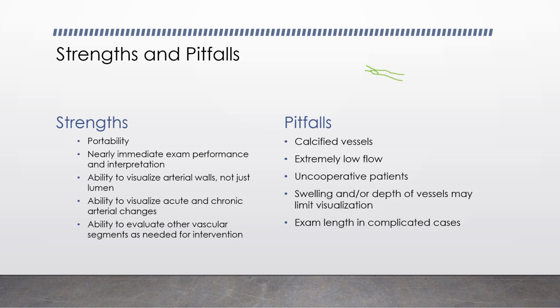Pitfalls. If you've done these exams, you know they can be challenging. So we can have calcified vessels, which can cause a lot of shadowing through the vessel and make it very difficult to assess the vessel either in B mode with color and even in spectral. Other pitfalls are that some of the smaller arteries, towards the distal leg, are going to have extremely low flow. So it can be challenging to pick up flow patterns, get good color on these really low flow areas.